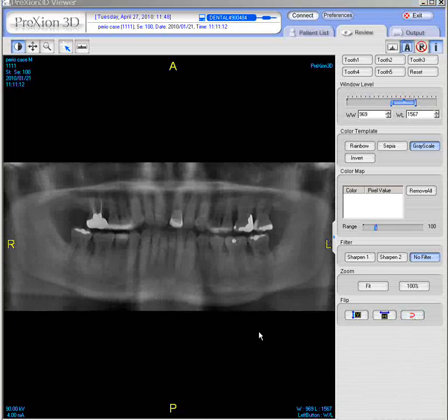Now if your support staff is going to eventually print this off on a printer, we may want to crop the outer black edges because that will add too much ink and take up too much toner on your printer. If you crop these two areas, you'll remove the patient name as well. But there's an alternate way of adding the patient name.